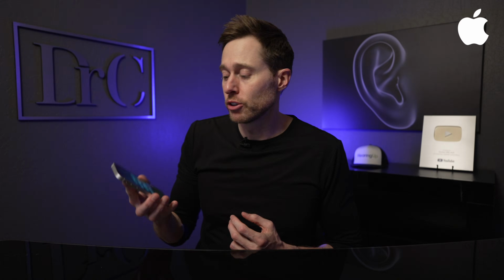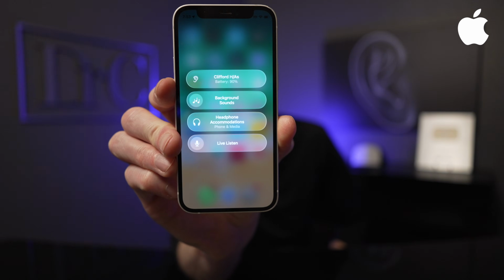The cool thing about this is that you can toggle this on and off depending on what type of environment you're in and what your preferences are. You can also, as you can see, toggle on live listen there at the bottom just by triple clicking the side of the phone and going into your hearing aids.